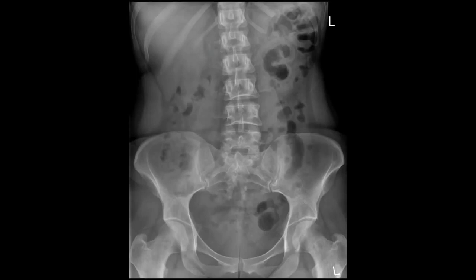Yeah, abdominal X-rays or any X-rays. First of all, we have to look at lots of normals to familiarise what is normal, what is the spectrum of normal, and then I just gave you the A, B, C because people like doing A, B, C. So if you can't remember anything, then try to fit things in A, B, C. And that's just one way of looking at it. It's an easy way to remember. You have your own way, and people have their own way. But that's just to help if you can't remember anything.